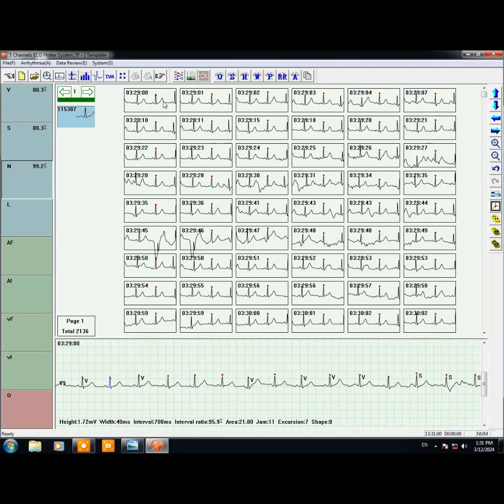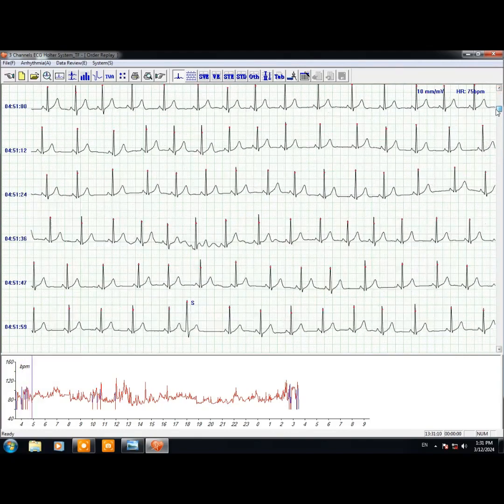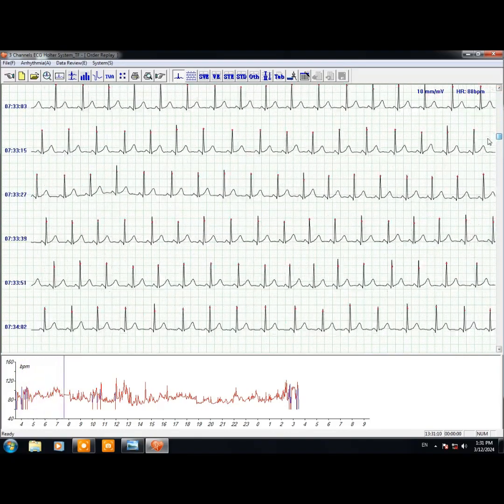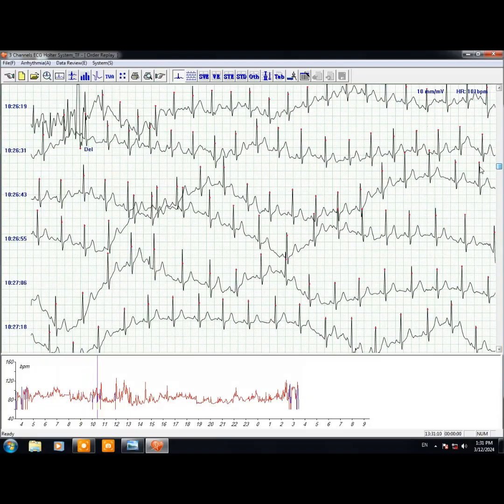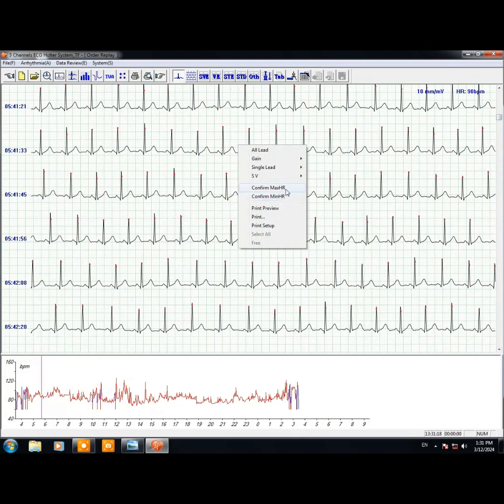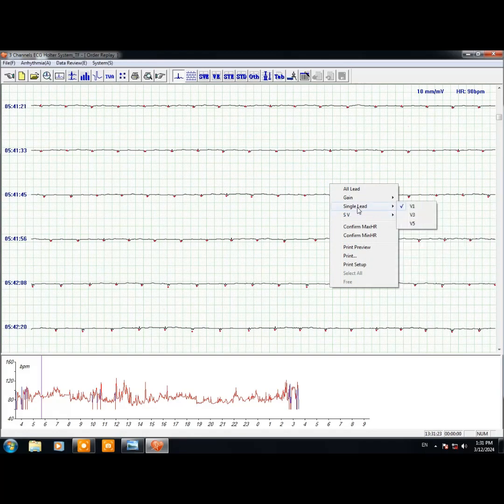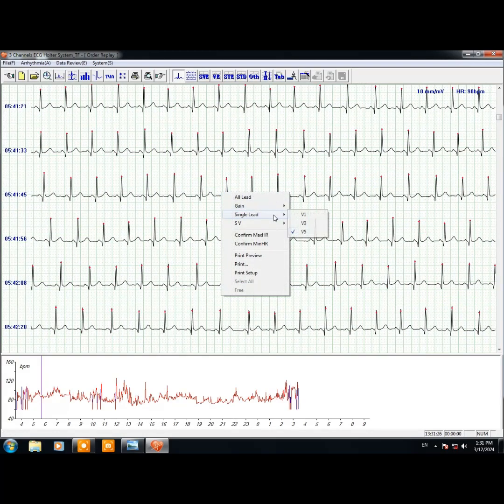When we're done with that, we go to order replay. Order replay shows us the entire recording. If I keep dragging down, I will see the entire recording, the entire 48 hours or less of recording. Here, we can change which lead we see. If we say V1, we will see only V1. If we say V5, we only see V5, and so on.